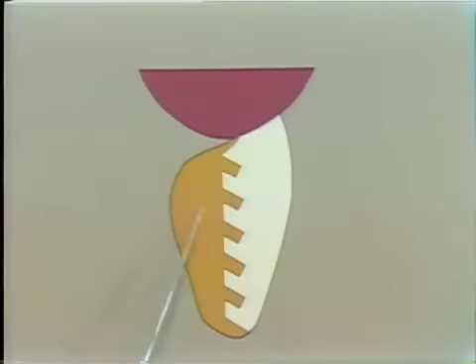When the backing is waxed up, nylon pins are placed into here, and when the backing is invested and cast, of course, it comes out with what I'll call reverse pins going into the porcelain. The facing is then cemented into position on here in the normal manner.